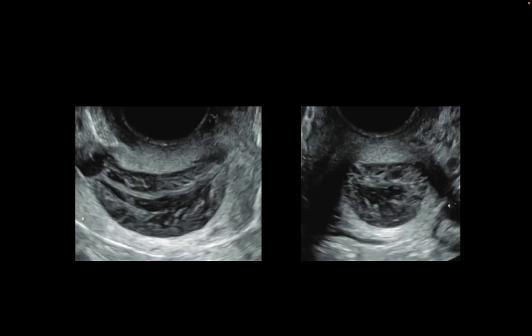Now, this is an image from the literature showing you a longitudinal and a transverse section of the cervix on B mode or grayscale ultrasound. And what you can appreciate here, we'll start from inside out, is first the presence of this anechoic content in the endocervical canal. So this is nothing but cervical mucus. Remember, it can be variable in amount. It may be minimal, it can be significant as you see here. Again, just the cervical mucus per se is not of any significance.